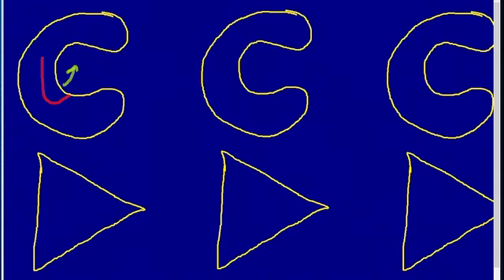And eventually you're going to have an imaging appearance, and forgive me, I can't draw this that great, but you'll have an imaging appearance that more or less looks like this. When you see a displaced flap of meniscus material projecting inwards, telling you that you're originally dealing with a radial tear, this phenomenon is referred to as a parrot beak tear, because the shape of this flap takes on the appearance of the beak of a parrot.